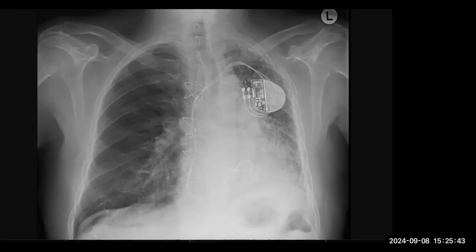Otherwise, it could be a case of single lung transplantation. So I would compare the previous radiographs in this case and then further evaluate this patient. Also discuss with the clinician regarding the current presentation. That would help me in further evaluating this patient better.